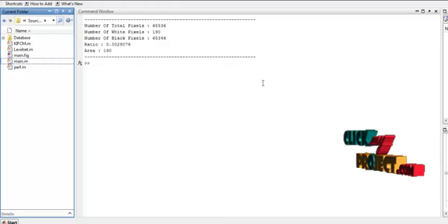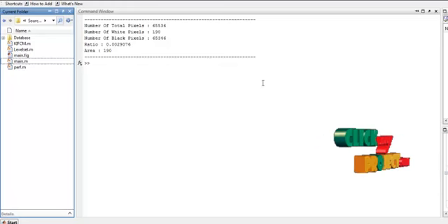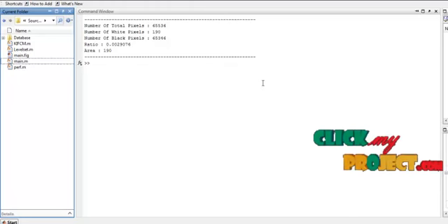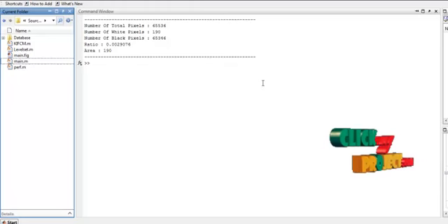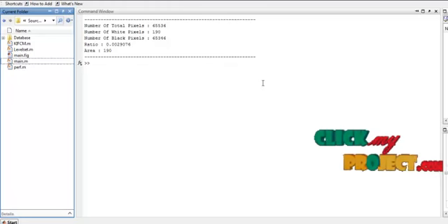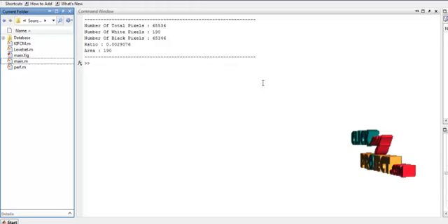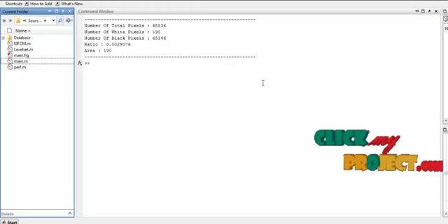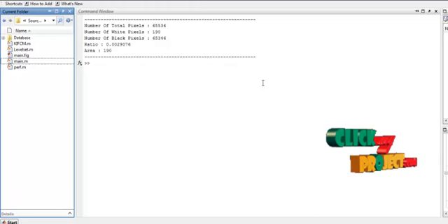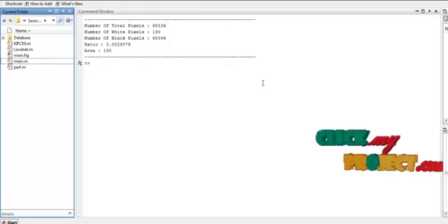Thus, we have segmented the tumor portions in the brain MRI images based on clustering techniques, thresholding techniques, and level set segmentation techniques, and we have measured the performance metrics for the process. The calculated performance metrics indicate that the proposed approach is more efficient compared to the other existing works.